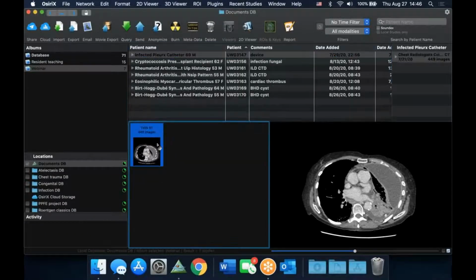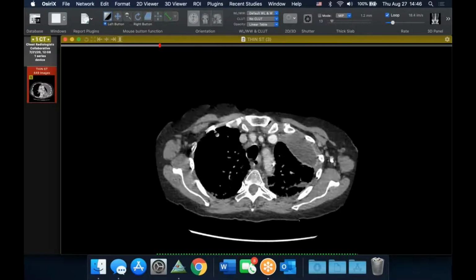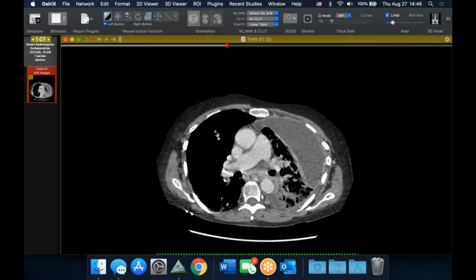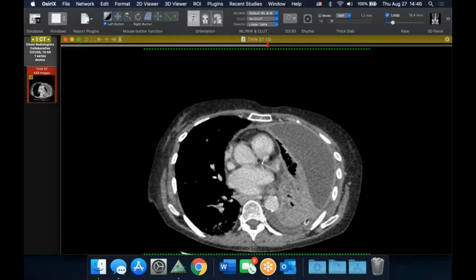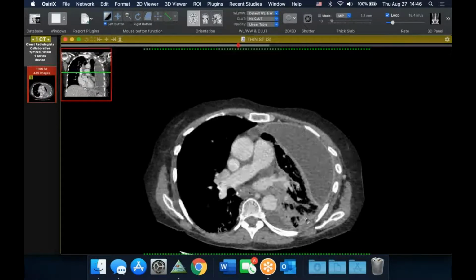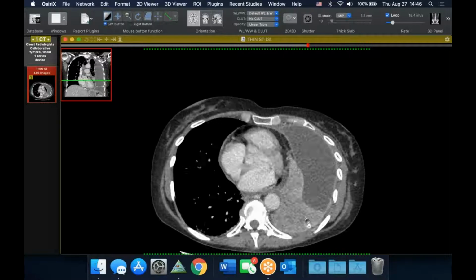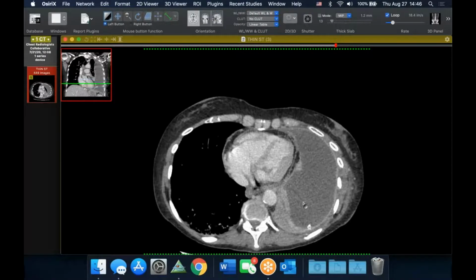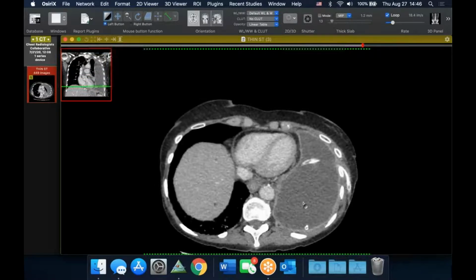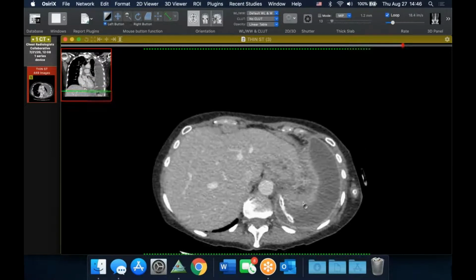This was kind of cute, something I never really gave much thought to. So this patient has an empyema, and that's not why I'm showing this, but, or I should say a complex effusion, and has a Pleurx drain in. I'm sorry, well, it is an empyema now, but a complex effusion. We see pleural thickening. The left lower lobe is unhappy, and had a Pleurx in to manage this. And it was a malignant effusion, but interesting, there was a lot of pus coming out.